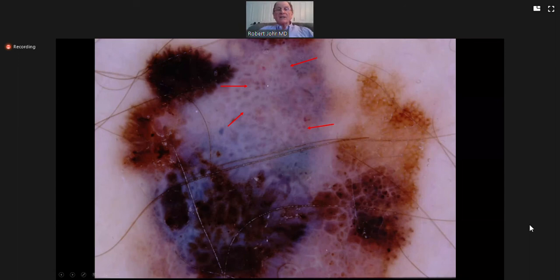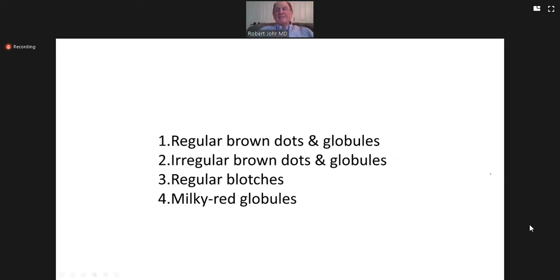The little pinkish structures. Maybe you should show the slide a little bit longer. Sure, okay. I'm new at this, actually. I've never done this before. Yeah, that's fine. Okay, we'll launch the same poll. What are these? Okay, so you read them. Read the answer, and tell me when I can go to the answer. We'll let half the people vote. Let's see. All right, that's it.